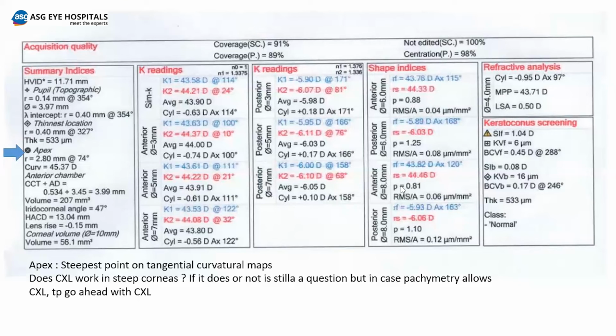If I compare it with Pentacam, in Pentacam we have seen the thinnest pachy, the temporalization of the pachymetry, Kmax, and then we have anterior and posterior elevation points, which we already mentioned. Just like in Pentacam, we have 12 and 17 for anterior and posterior elevation point. Here we have 7 and 12, which is a rough guideline. So that KVF and KVB is given on the extreme right value side. Can you see? This KVF should be less than 7 and KVB should be less than 12. So here a bit of posterior ectasia is starting according to this.